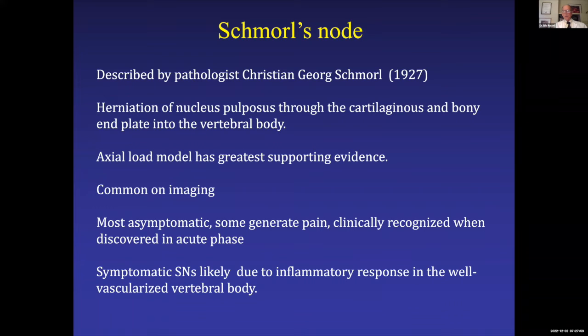They're often seen without any acute symptoms because they may not be apparent and come to light when the patient becomes symptomatic from them, if they ever do. But they're extremely common on imaging and they're worth commenting upon. Some generate pain, especially you'll recognize it if the patient presents with back pain and you have a Schmorl's node, this end plate depression with, on MR, marrow edema around it. That might be a clue that it's recent.